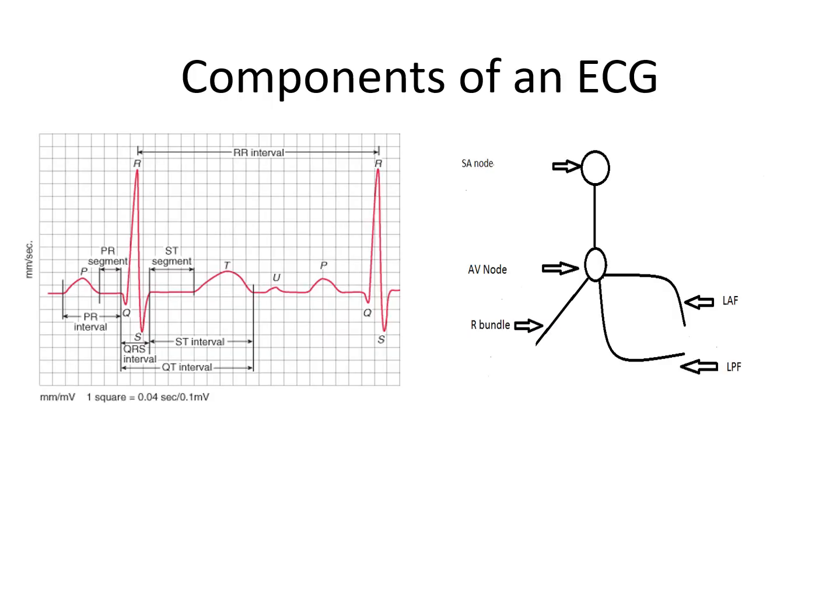Let's look at the components of an ECG. The first thing is the P wave. Now, what's happening here is the SA node fires first and depolarizes the atria, first the right and then the left. And those two create essentially two little triangles that, when combined together, create the shape of a P wave.